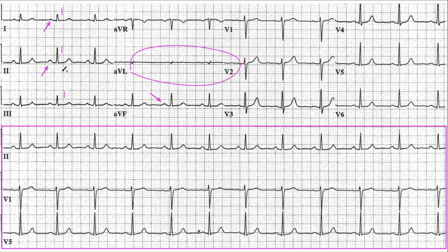What else? So that was Einthoven's triangle, or frontal plane. Now we're getting into the horizontal plane, or chest leads, or precordial leads. Let's see here. Everything seems to be fine and dandy. A little bit of that Q wave up here as well, not pathological. Early R wave progression. So the R wave here, see that? Slowly, slowly, slowly, and then boom, all of a sudden it jumps.